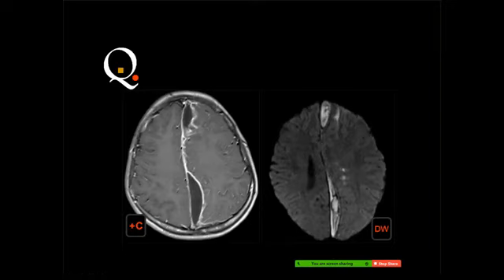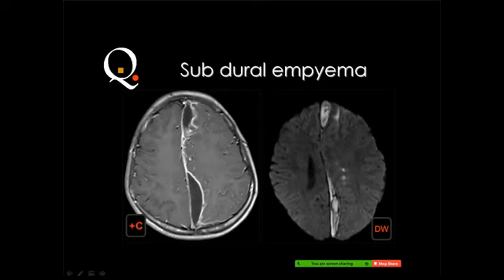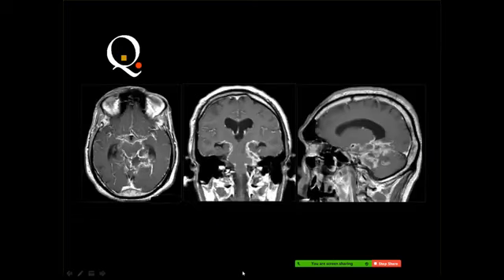Subdural empyema. Yes, subdural empyema, the classic appearance with marginal enhancement in the interhemispheric fissure and the diffusion restriction in the diffusion weighted image.